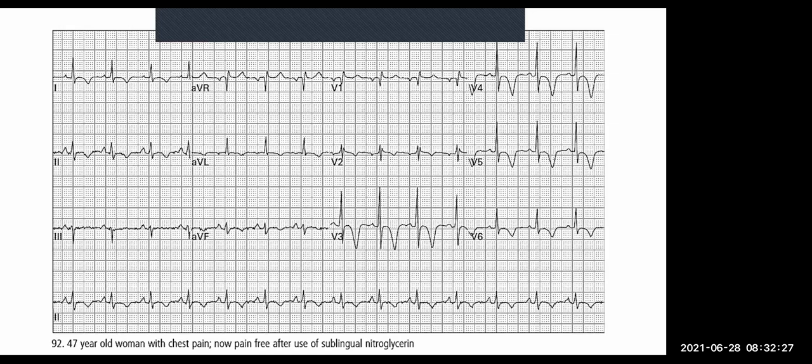Have you ever heard of hyperacute T waves in ischemia? Or basically long, tall T waves that are pointing upwards, all right? Okay, if you remember hyperacute T waves, this is also almost like the opposite of that, you know? They're like falling the other way, you know? So it's like something that's fallen completely the other way, but it doesn't look normal, that's for sure, right? So it's these deep symmetrical T waves, all right?